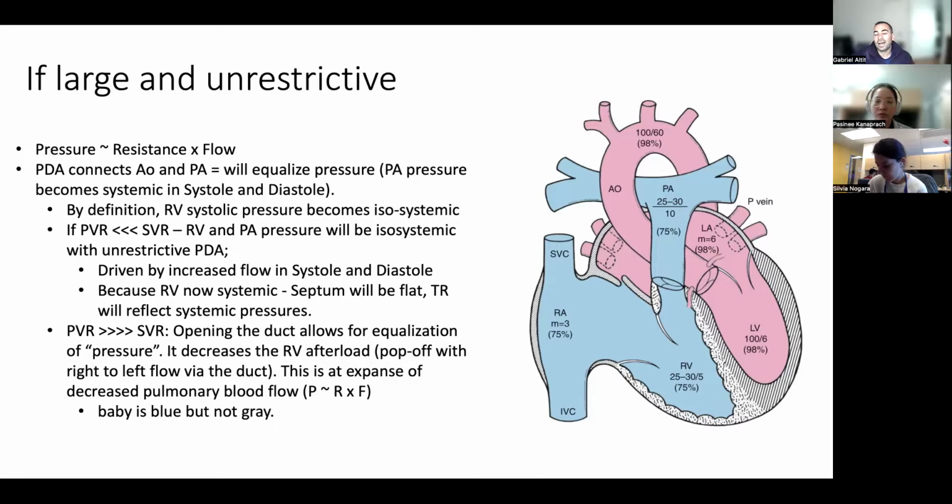In adult populations, they'll often have significant mitral regurgitation or significant mitral stenosis to explain that. But some of our patients may also have these kinds of situations. You can think about patients with small left ventricles, parachute mitral valves, abnormal atrioventricular valves on the left side, for example some of the imbalanced AV canal and things like that. That could be one of the reasons why they have LA hypertension. And when you have LA hypertension or pulmonary venous hypertension, you can get a phenotype of what we call post-capillary pulmonary hypertension.